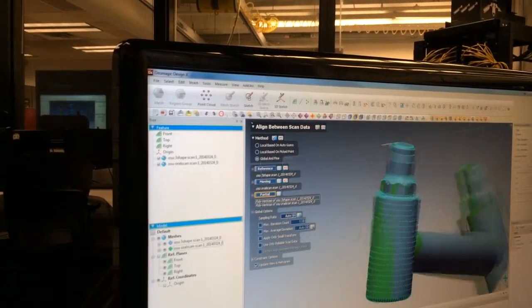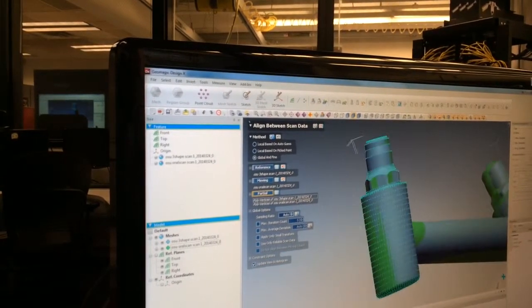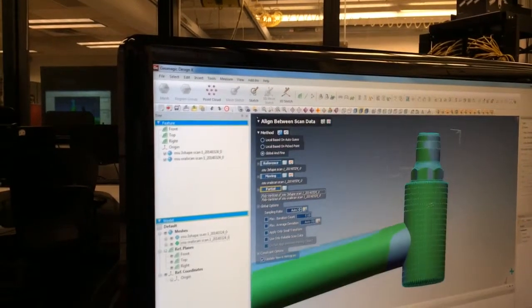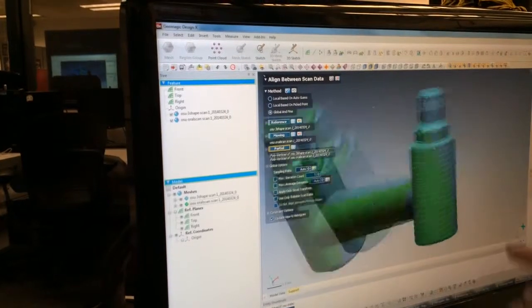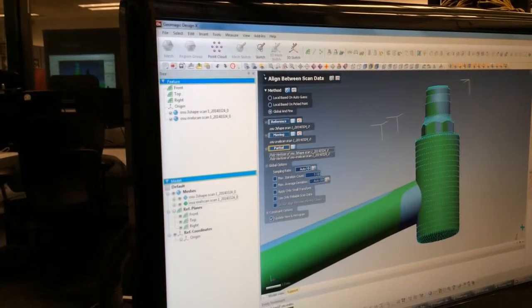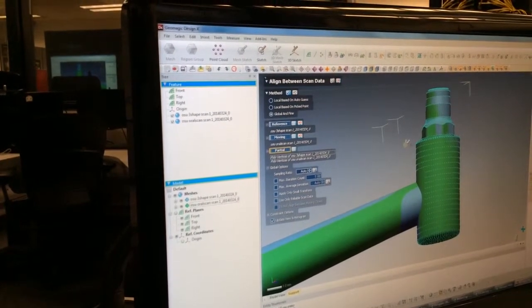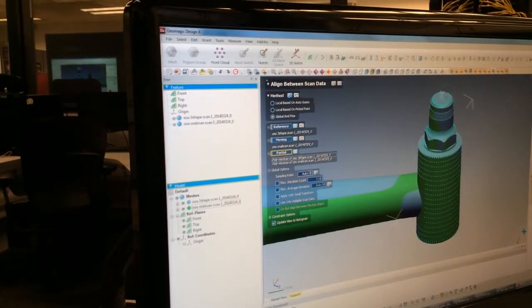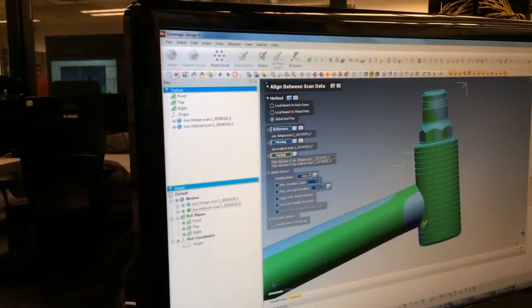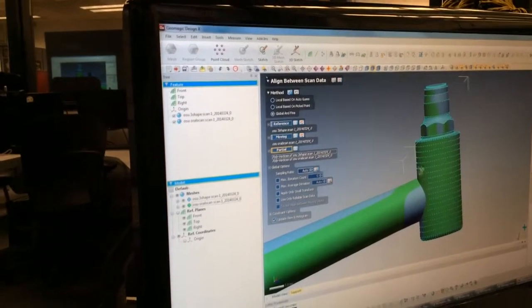And what you can see is that with this rectangular one, it's getting both the ones on this side and the ones on the back side. If you want to be more precise, you go to paintbrush mode. And then it's just the surface. I already grabbed most of these, so I'm not adding new ones, but for instance here, I can add some new ones.